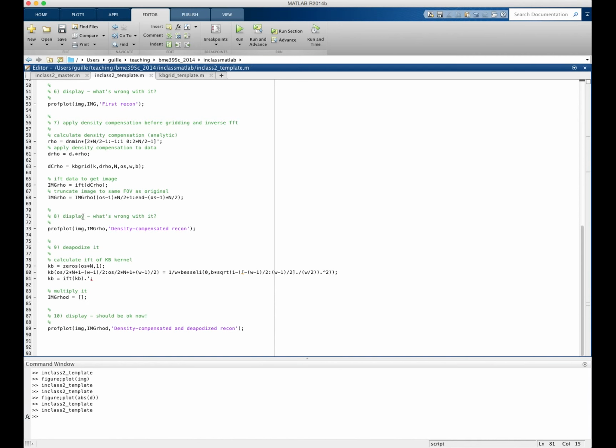So now this is the function that we need to divide out of our image. We take a dot transpose so that we can directly multiply it, or divide it out of the data. After we take this inverse Fourier transform, we now have the image domain copy of the kernel.